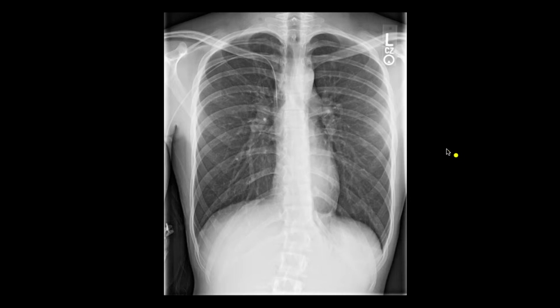Where do you measure from? Can you show us on the X-ray? Well, whenever you can, you try to measure them when you can clearly see both margins. So you can just measure in a transverse dimension, usually measure it just close to the hilum, because obviously as they go more distally and start to branch, they're going to be smaller. So you really want to be measuring the main pulmonary arteries. Great.